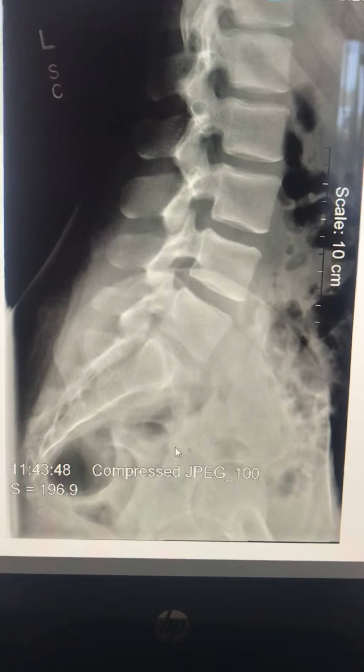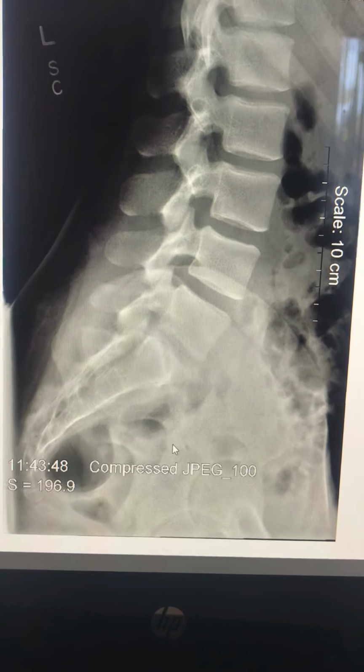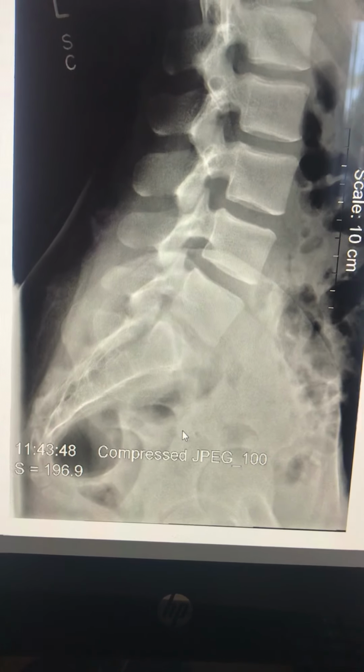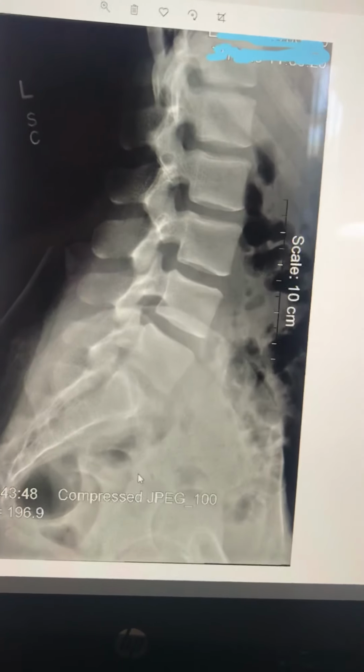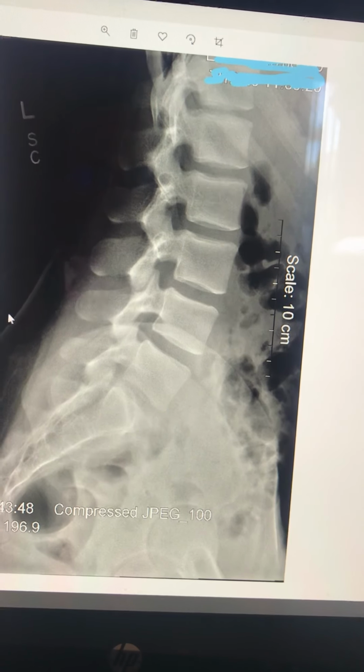The exposure is diagnostic quality. The patient was placed on the left side with the L spine centered to the long axis of the IR. The knees were slightly bent, and the CR was centered to the iliac crests right here.